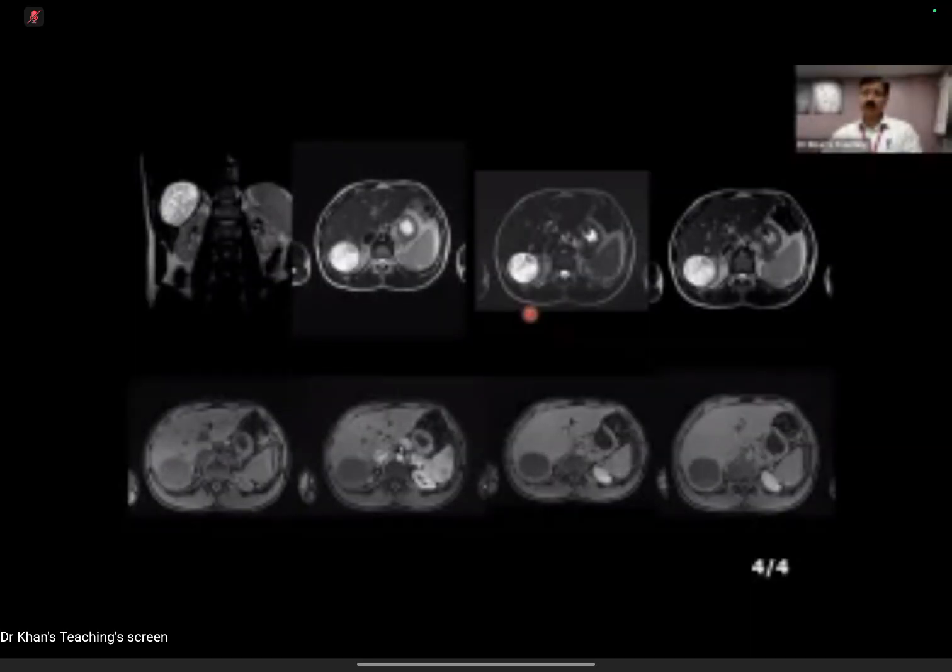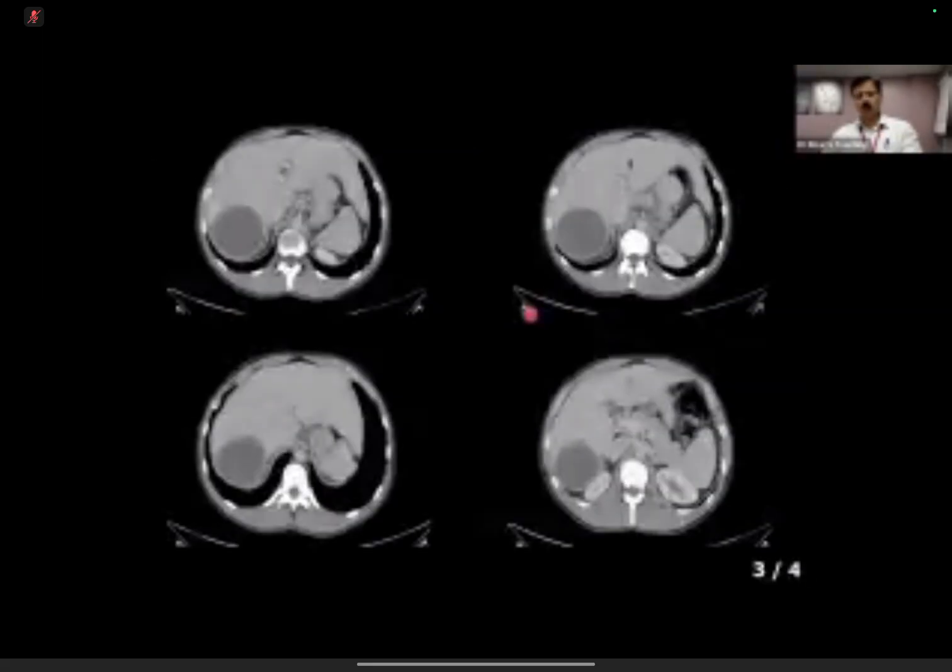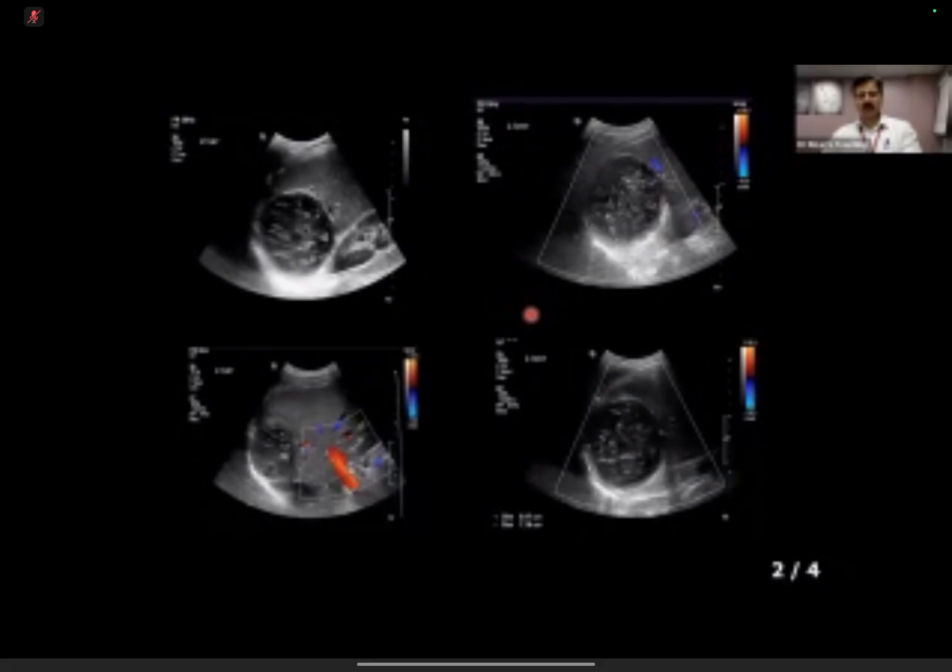And candidate 5, I'll ask you to raise your hand in a while. Hydatid cysts are important for the exam. Many scenarios in which even brain, chest, liver, peritoneal, all of them have come in the exam. There are many features of hydatid cysts, and on some imaging they can give you a pseudo-solid type of appearance like here, right?